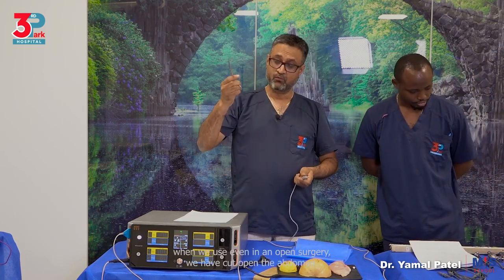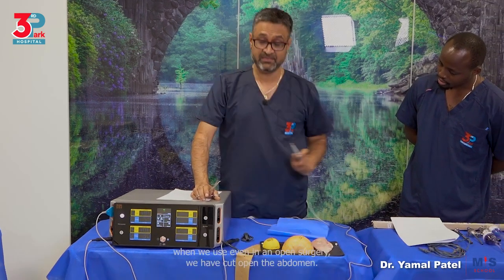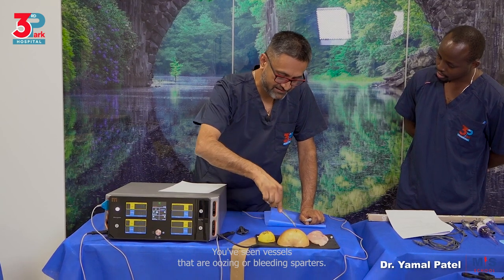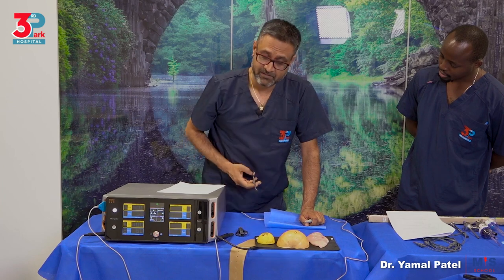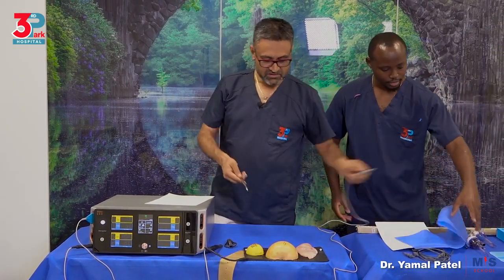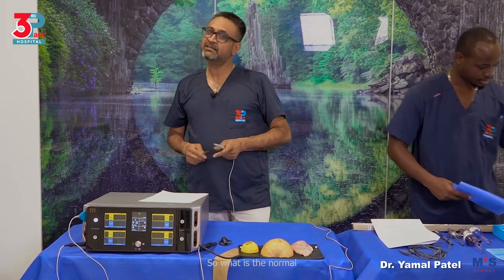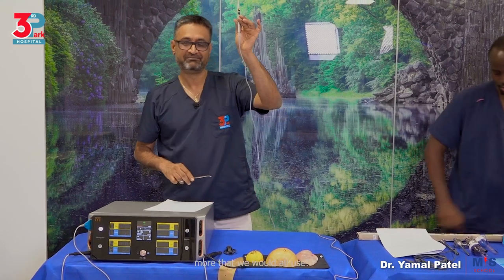Second thing is when we go on to a very practical scenario that we all work with. Even in an open surgery, we have cut open the abdomen. You've seen vessels that are oozing or bleeding, spurters. You take arteries or hemostats and you hold them. The next thing you do is you tell your assistant to go and burn these vessels. So what is the normal mode that we would all use?